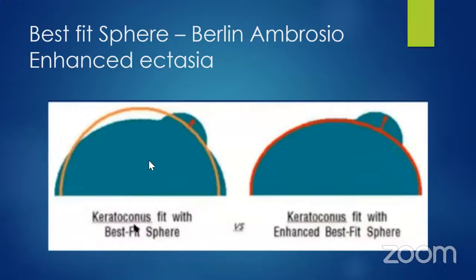So this is the best fit sphere, and the Belin-Ambrosio enhanced ectasia takes into account that if there is some localized area of ectasia, then if you take an overall best fit sphere, that is going to underestimate that area, because some area is above, some area is below. So you may not be able to pick it up.